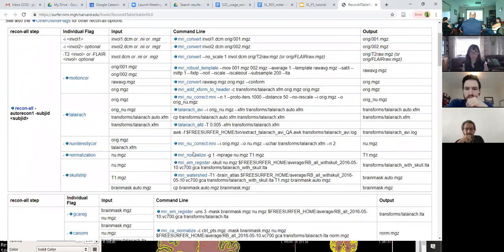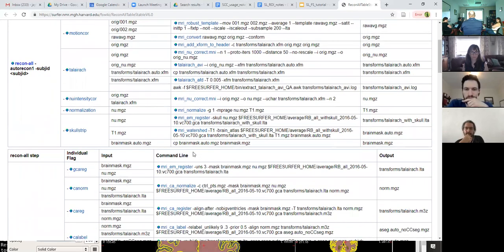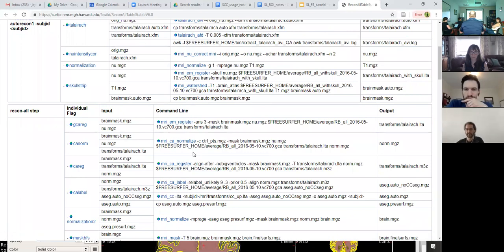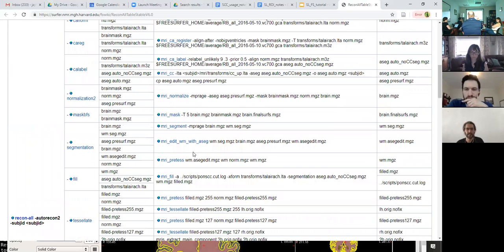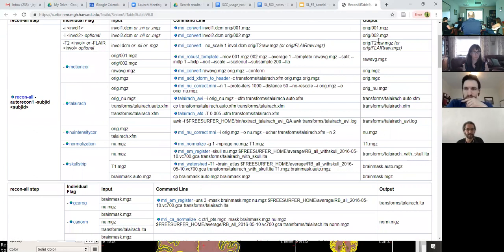Just talking about, I guess, what we would call it, but in practice, you do need to rerun certain steps here. You determine what that step is, and then it will overwrite files that it needs to. And you have a log.